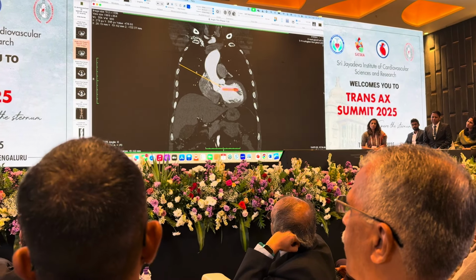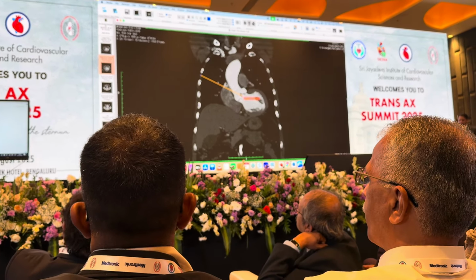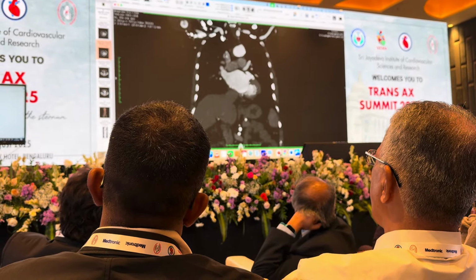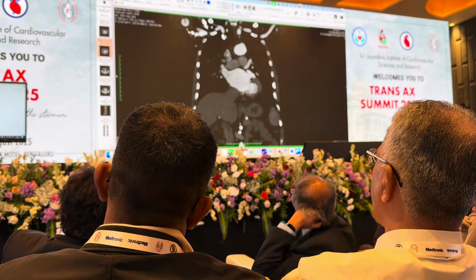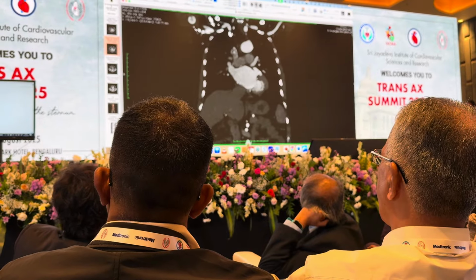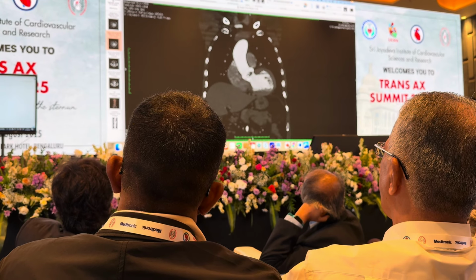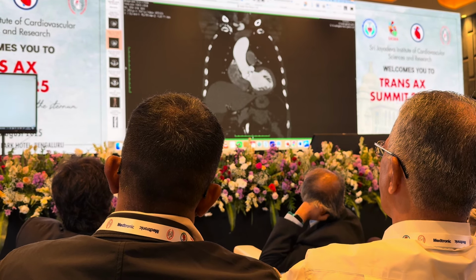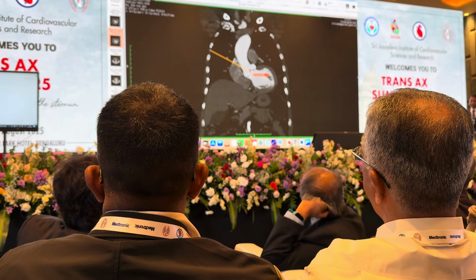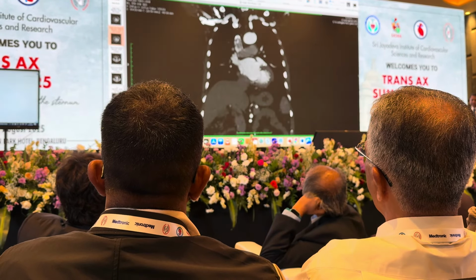What you also can see is where you make your clamp. The clamp position is very important. So let's imagine, you agree this is the transverse sinus, this is the left atrium, this is the pulmonary artery. So if you put your clamp here, where you normally put your clamp when doing mitral valve, so I drop the pointer, I scroll, you see, my clamp would be extremely low. I would not have sufficient aorta to open and to get access to the valve. My aortic clamp should go higher. I would say above the pulmonary artery, which is this one.